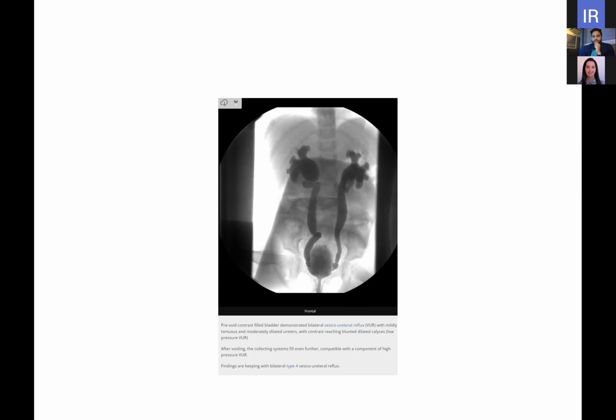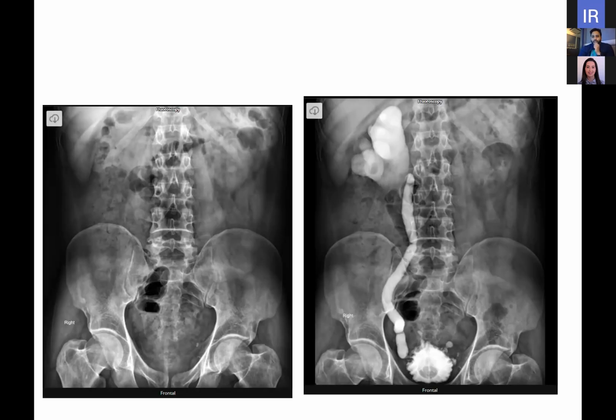So our patient has unilateral disease. So we would see something like this. If the diseased kidney, if the cystic kidney is on the left-hand side, then we would expect to see reflux in the opposite kidney.